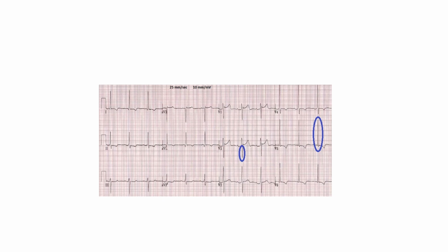So we can probably diagnose left ventricular hypertrophy. You can also see that like right ventricular hypertrophy, here are also associated ST segment depression and T wave inversion in lateral leads, which is termed as left ventricular strain pattern.